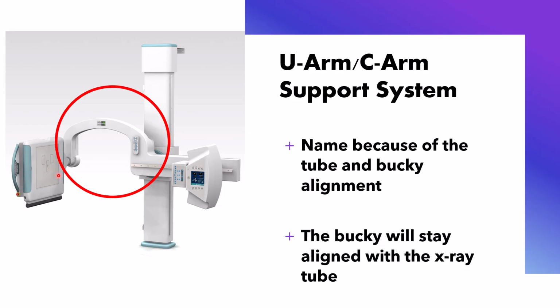These two things are always facing each other. Now you can turn this upright, you can angle this, but these two things are always going to be facing each other. The Bucky will stay aligned with the X-ray tube at all times.